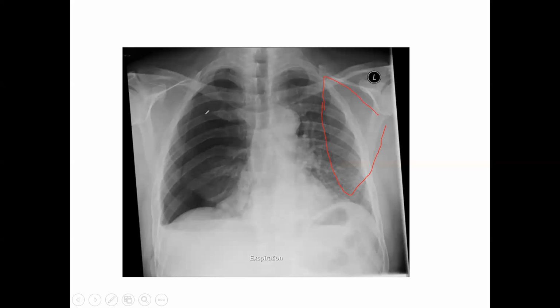But if you come over here on the patient's right-hand side, you still have some scapula shadow over here, but notice these vascular markings stop pretty much right there as well. You can see this distinct line that shows up through this area, and there's a little bit of space in between those lines. So you've actually got your scapula shadow there, but also the distinct lining of the pleural line of the lung. So we've got an increase in radiolucency here. That lets us know that we've got a pneumothorax on the right-hand side.